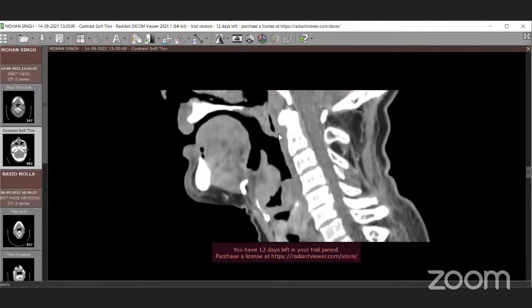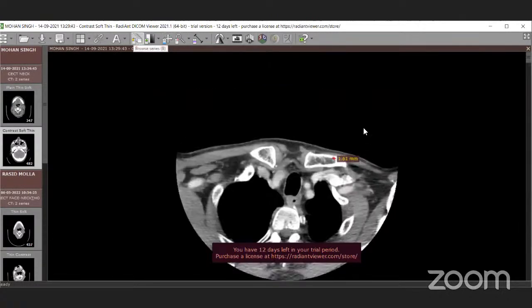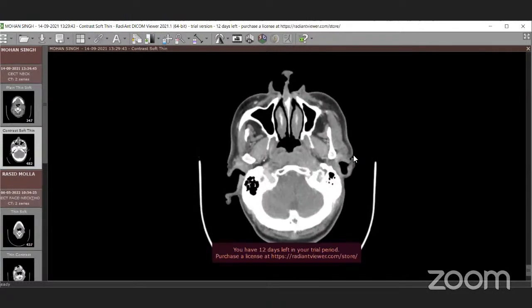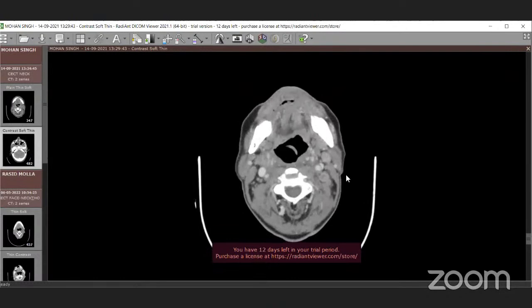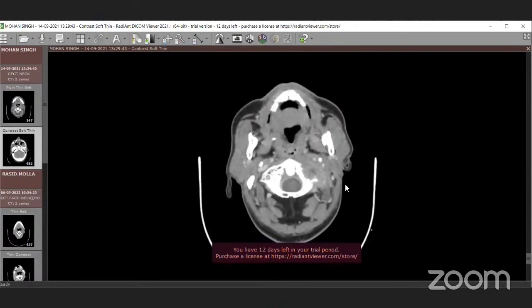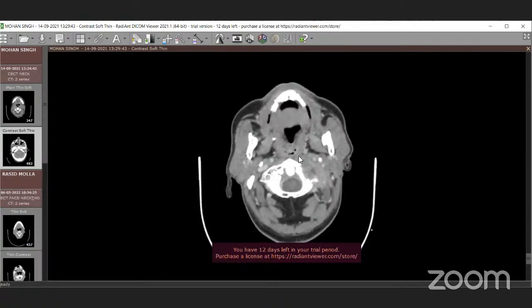And this is the posterior margin of the oropharynx here. And what I think Dr. Kaustuv had asked me to show is the constrictors of the pharynx, and that will be a pertinent thing at this point of time. Starting from above, we have a sling of muscle here.